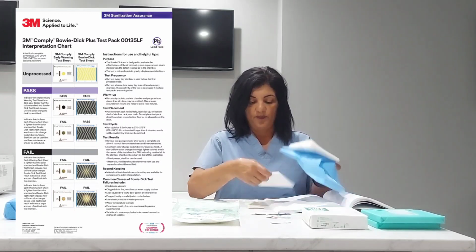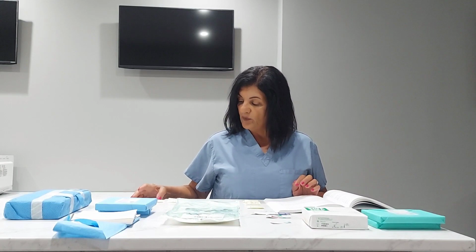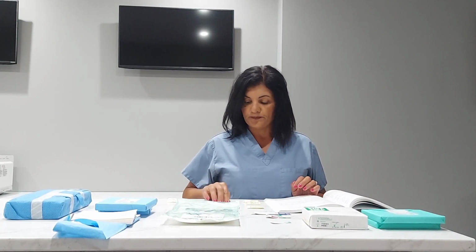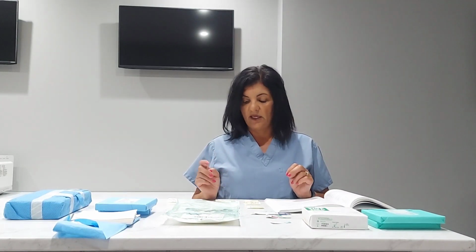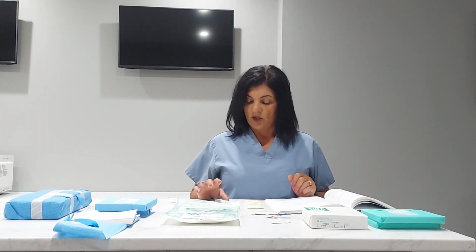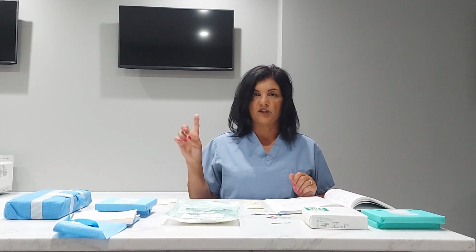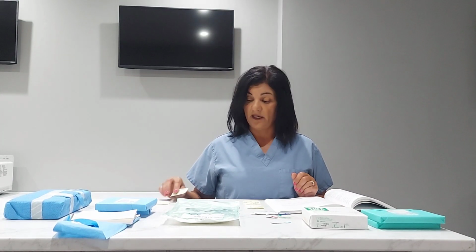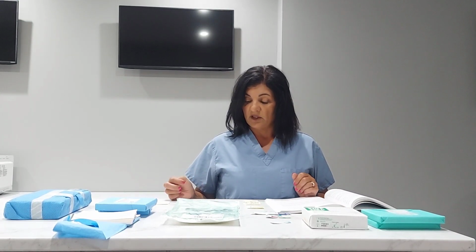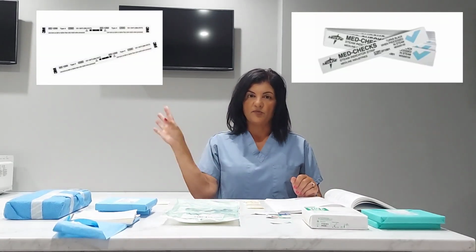So moving to your class 3, I don't have an example of a class 3. A class 3 is a chemical indicator that's designed to react to one of the 3 parameters. The 3 parameters again: time, temperature, steam under pressure. I will look up a copy of a class 3 and post a picture of it so that you know what they look like. Same thing with the class type 4. I do not have an example. I will post a picture of it.